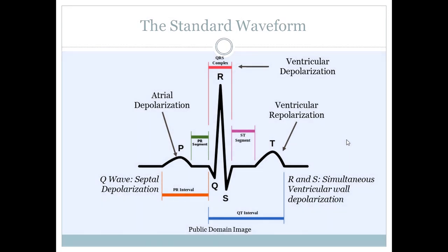This is the standard waveform. This is a textbook perfect waveform. You'll probably rarely, if ever, see it, and it is from lead 2. Recall that lead 2 measures change in voltage from the right arm or shoulder to the left foot, or left upper quadrant of the belly.